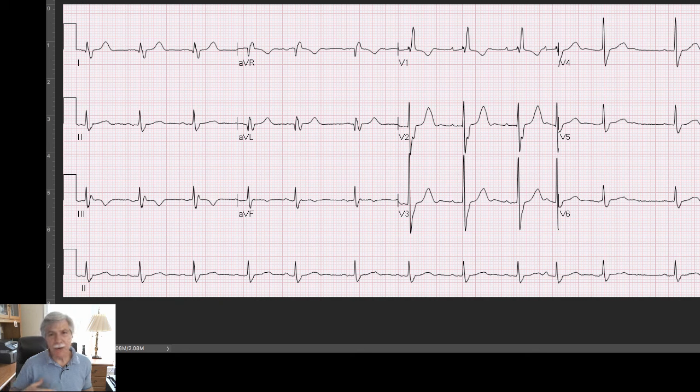And unless you understand why people have considered those to be consistent with trifascicular block, it's kind of hard to realize. It's hard to remember not only when to diagnose it and when to sort of write it off, but I wanted you to understand the whole idea behind it. If you add a first degree AV block, does that mean that you have trifascicular block or not? So let's just take a look at this cardiogram.